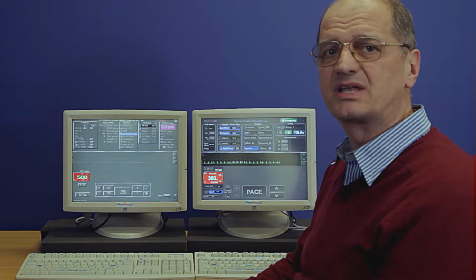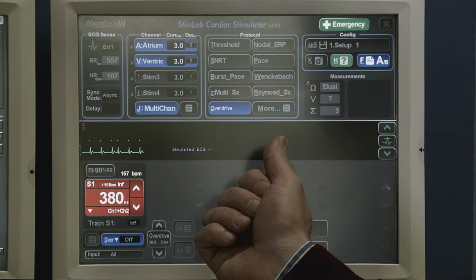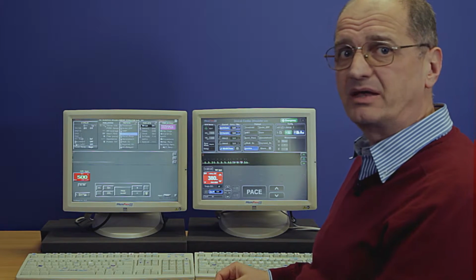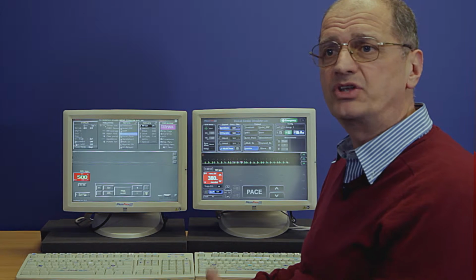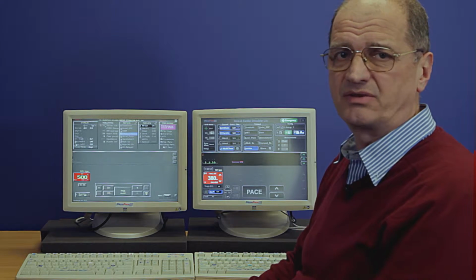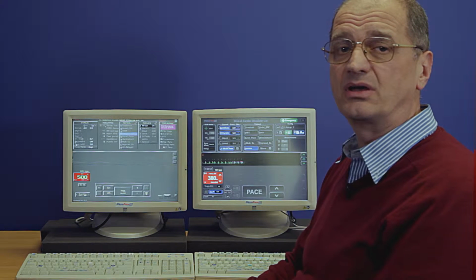For the purposes of instructing customers and the knowledge needed by clinical specialists, the software is retrocompatible. The keyboard shortcuts remain the same, and the basic architecture of the software is also preserved, which means that you don't have to go and retrain customers, and clinical specialists also don't need any significant retraining. There are, however, significant improvements to the software, of course.